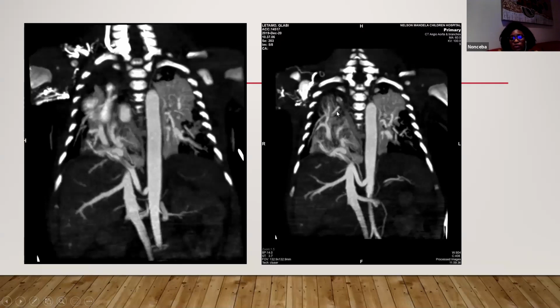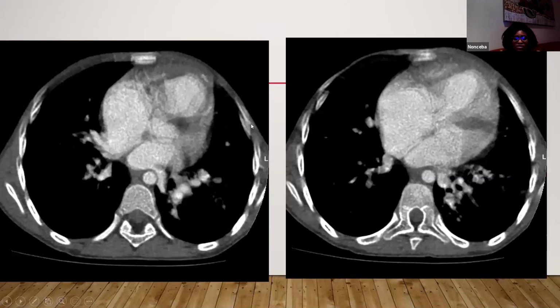So the right lower lobe, when we compared it to the opposite side, we were concerned that this could also be an extralobar sequestration. So in this patient, we have those associations where you've got PAPVR, and then you've got sequestration, and you've got the Scimitar vessel. This one was the child I was saying that presented later in life, or I don't remember what they were presenting for.